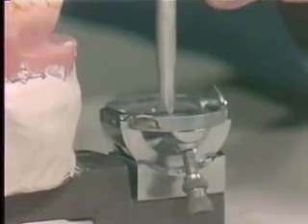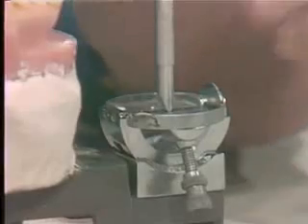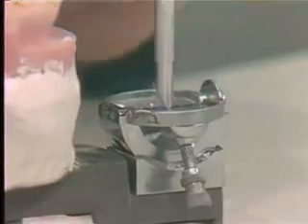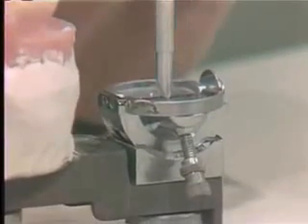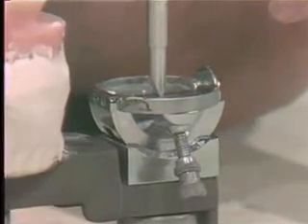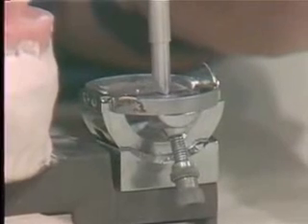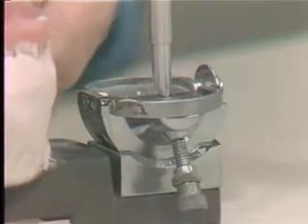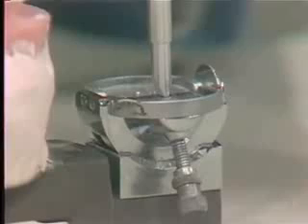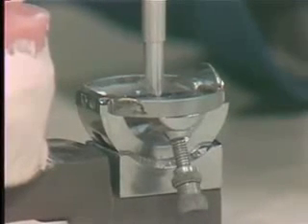Now this relates to the thickness of your centric relation wax bite. When you take your centric relation wax bite, you're going to have a certain thickness between the teeth, and we'd estimate it to be somewhere in the neighborhood of 3 millimeters. So you would want to drop this pin about 3 millimeters so that when you put your bite in, and then when you remove the bite so the teeth come together, the pin would be centered again.